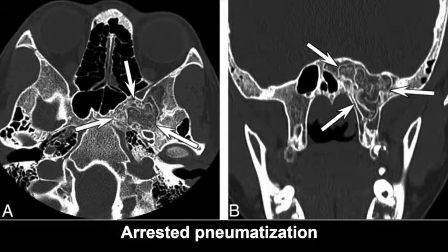If you all saw this, like I did, this is actually conventional CT, non-enhanced. This is the sphenoid bone, okay? This is the pterygoid process region, okay? And if you look in there, I swear to God, the first time I saw that in cone beam, I'm going, what the, you know? Is that a central giant? No, it couldn't be central giants. Maybe it's a giant cell tumor. Maybe it's an aneurysmal bone cyst. It's arrested pneumatization.